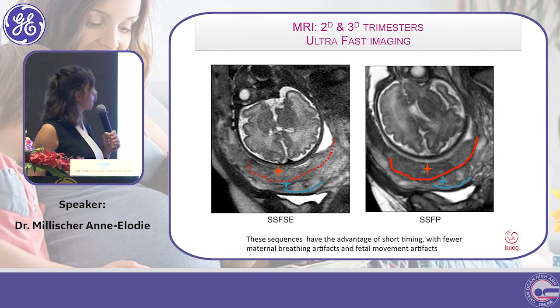Và một cái đặc điểm cũng tốt của cái MRI nữa là nó có một cái độ tương phản tốt giữa bánh nhau và cơ tử cung. Nó có một cái giới hạn giao diện bề mặt giữa hai cái này khá là rõ.